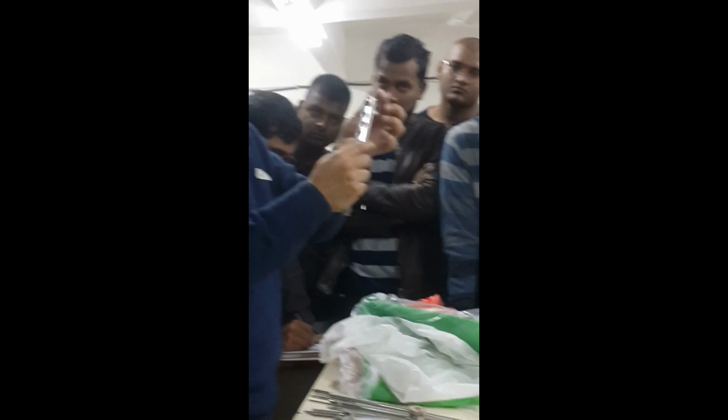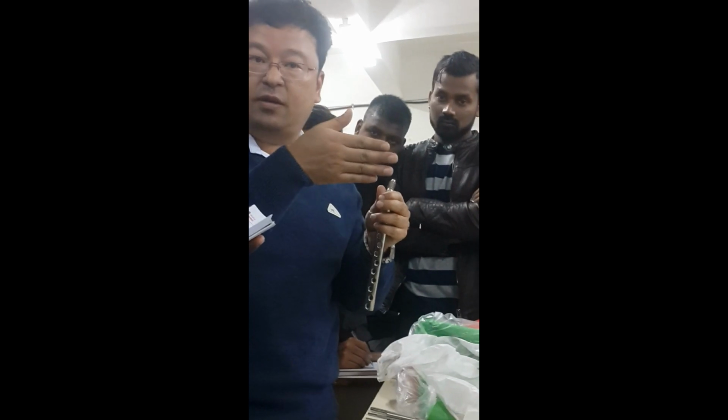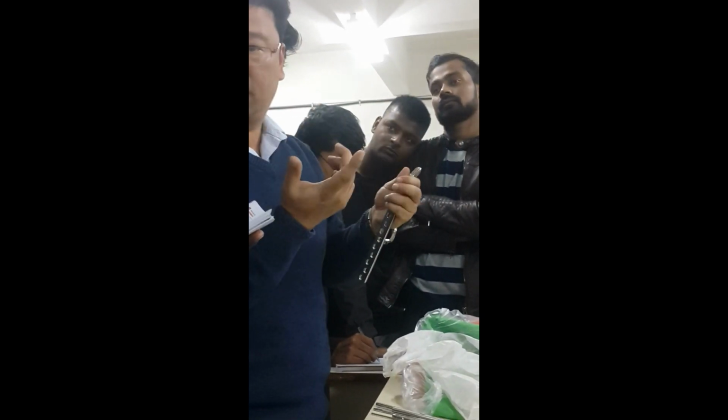There is some movement, okay? So when the patient mobilizes, the fracture collapses and there will be fracture compression. The two ends come together, then the fracture will unite. Okay? So this is a favorite one.